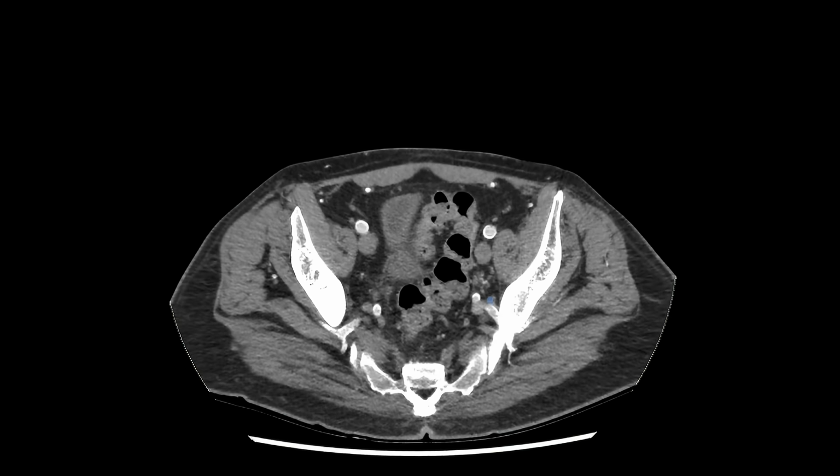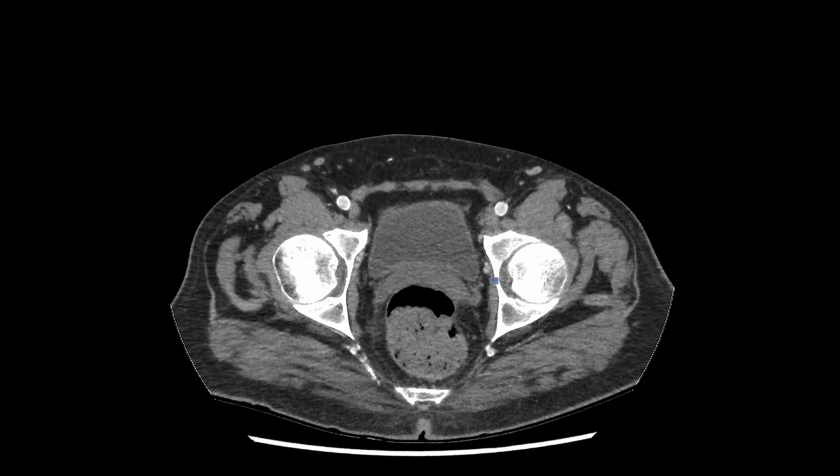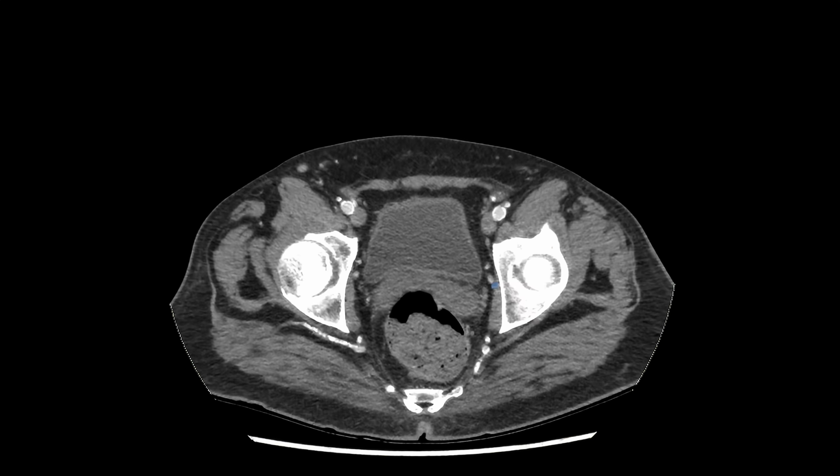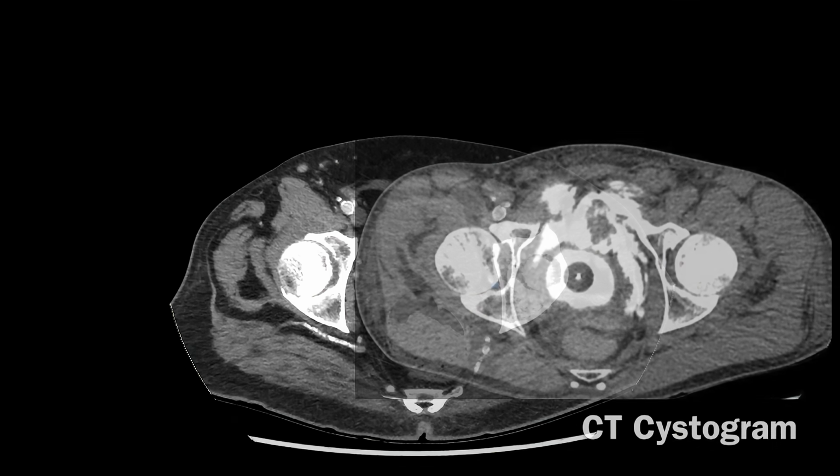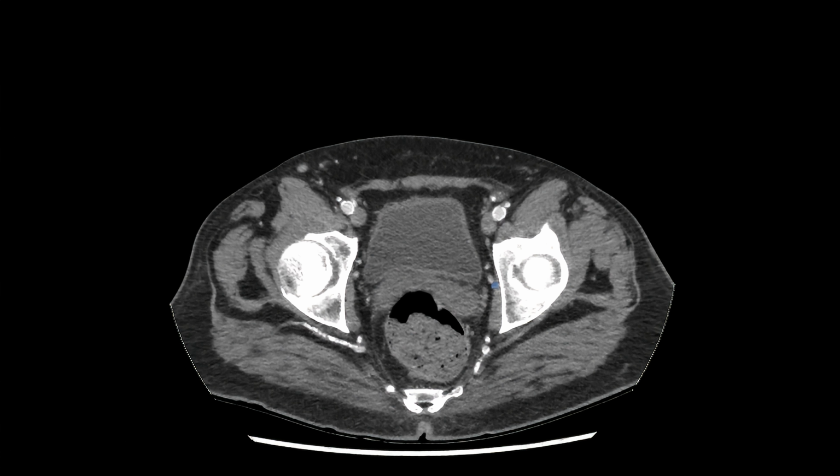The reason why this anatomy is important, there are many clinical reasons. One clinical example, we've put up a picture over here. This is a patient who had pelvic fractures and hematuria or blood in the patient's urine. And this is what is called a CT cystogram. Patients who have abdominal trauma or pelvic trauma with pelvic fractures and hematuria, the first thing you need to think about or rule out is a rupture of the bladder. When you're diagnosing a rupture of the bladder, the type of bladder rupture is very clinically important.